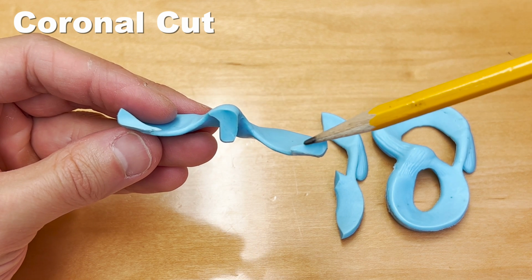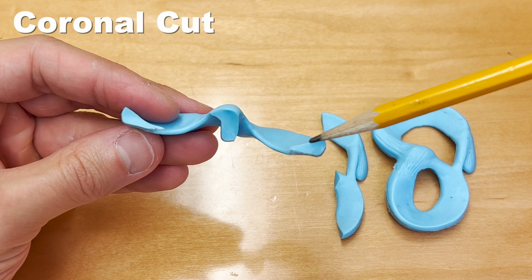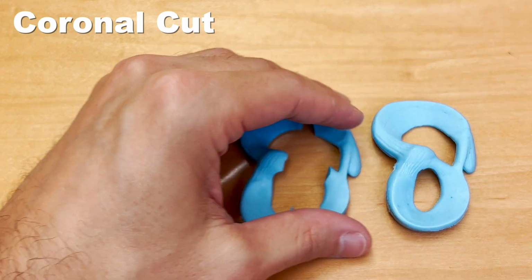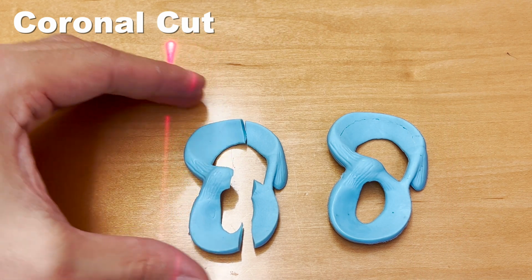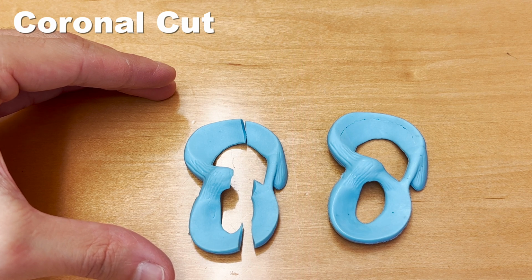Over here, you can see how this leaves this triangular shaped aspect to the meniscus on this side, and this triangular shaped aspect to the meniscus over on this side. This is what we would actually see on the MRI as we move from front to back through the meniscus, just like that. So that would be producing a coronal image.